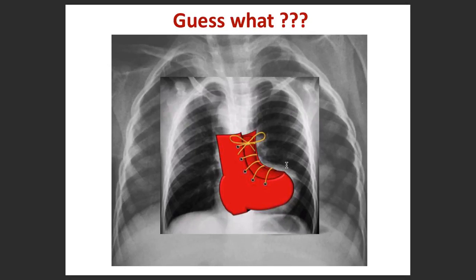It is not always present, but in the majority of patients, up to two-thirds of patients with TOF, will have this. The narrow upper part of the boot results from a small or absent main pulmonary artery, partly caused by a narrow infundibulum and a hypoplastic main pulmonary artery.